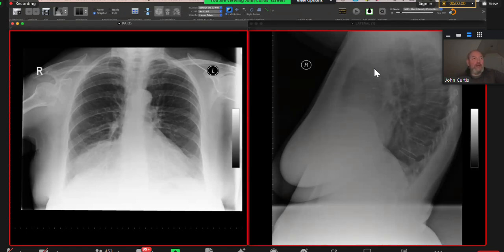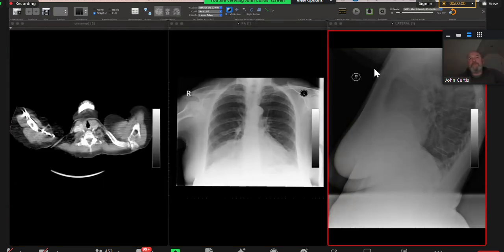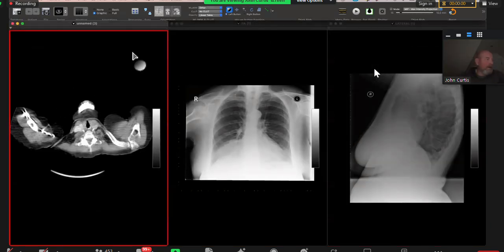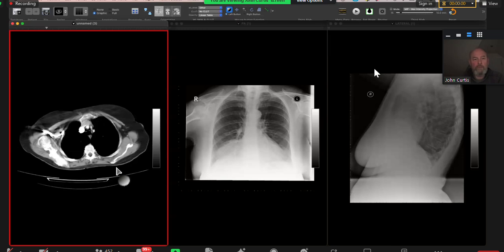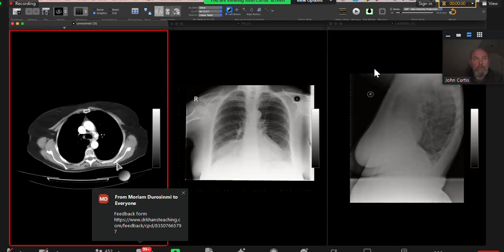Let me just take the mouse. Okay. So Amruth Vanahali wants me to show you another case, but I think we'll leave this one. This will be the last one. Okay. Nice try, Amruth. Okay, scroll through that. Okay. So I'm provided with the CT chest, mediastinal window.